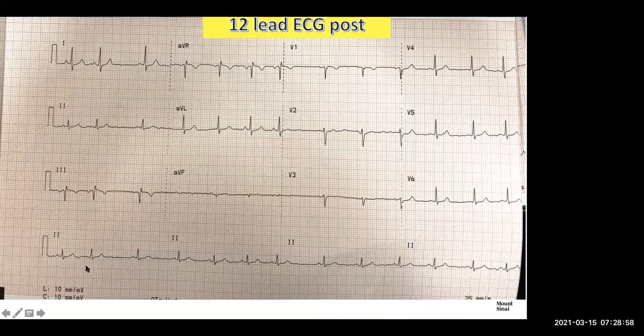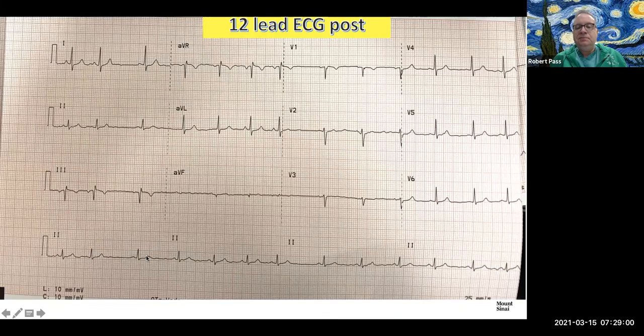And now this is the EKG, and I just wanted to show one thing about this. Sometimes when we look at an EKG like this, and you look at some of these leads here with this very wavy baseline, you might have the impression that the patient is in some kind of atrial fibrillation. But always look at the other leads, because these are all simultaneous. I think you would agree that in some of the other leads, it's very obvious that this is sinus rhythm. So this is just some kind of artifact, and this is sinus arrhythmia with some artifact on the AVF lead. Okay. All right, good job.